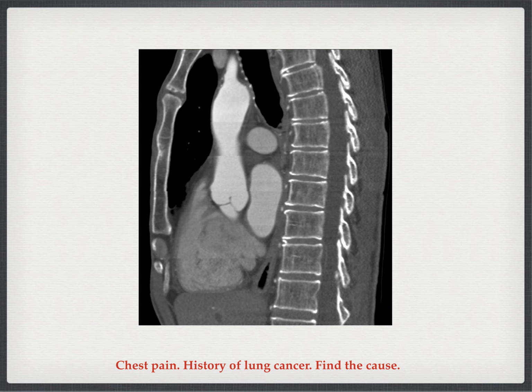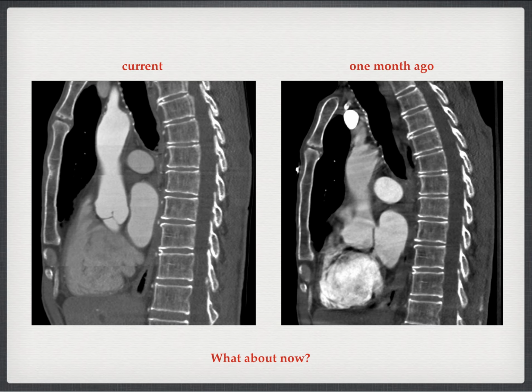All right, so this is a CT scan, and it does have a fracture, and I'm going to challenge everybody in the room to actually find it. To be honest, I don't think I would be able to detect this fracture, even in retrospect, but you guys are very smart. In fact, I'm going to help you.